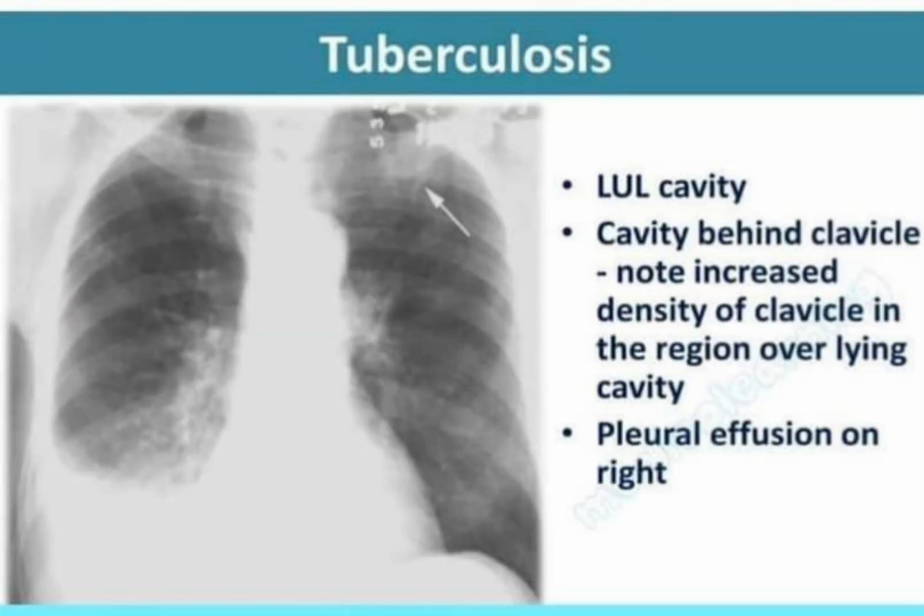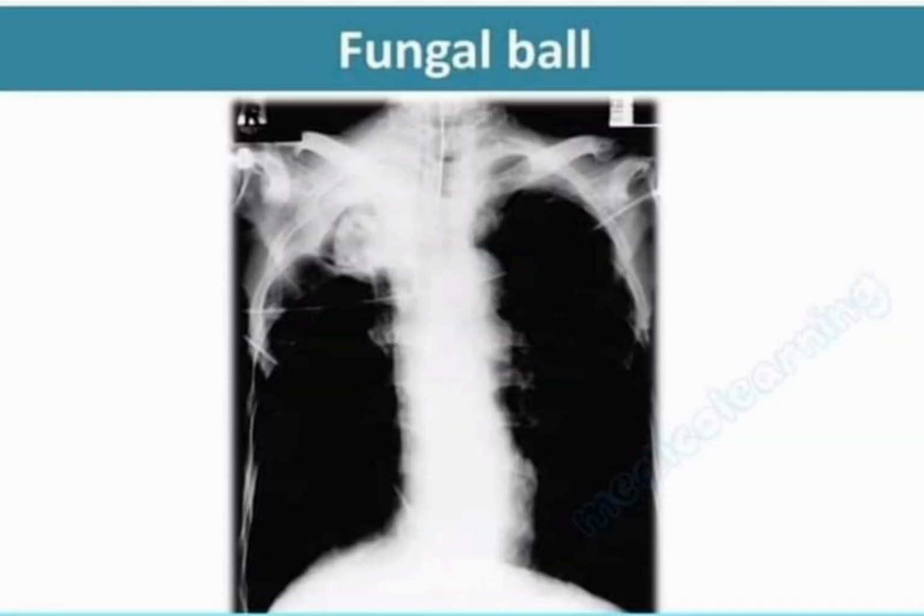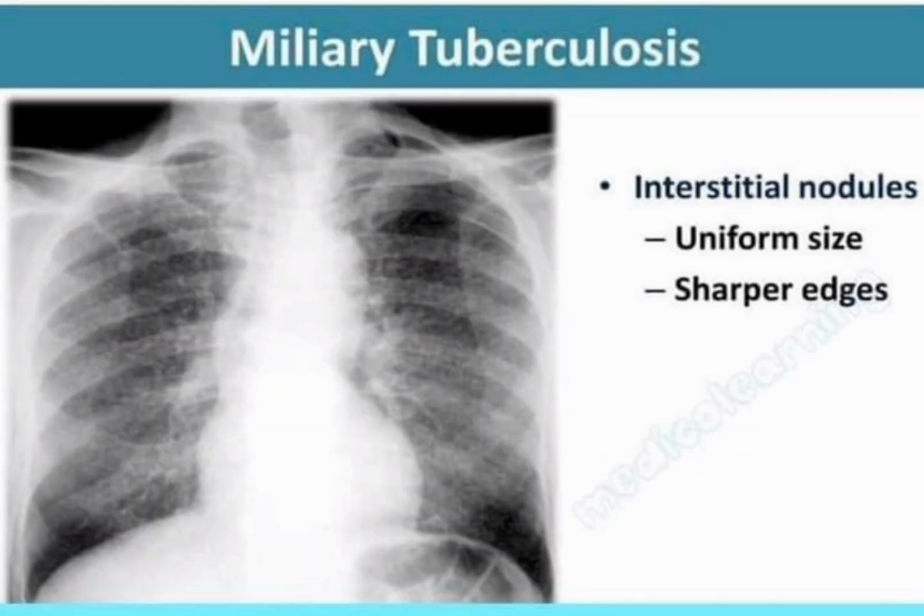Chest X-rays can show changes or problems in your lungs that stem from heart problems. For instance, fluid in your lungs can be a result of congestive heart failure. The size and outline of your heart.